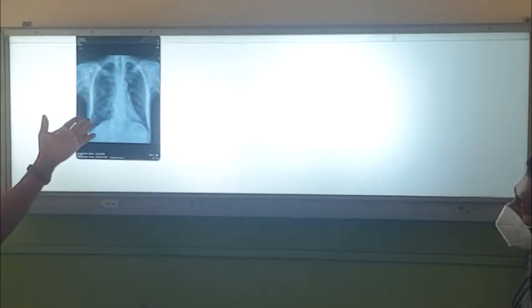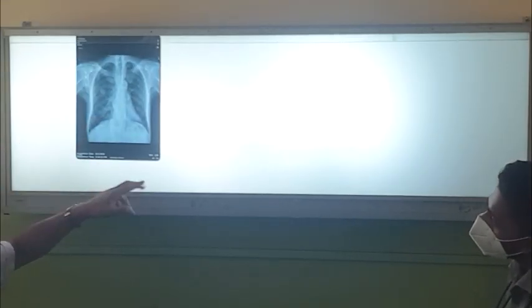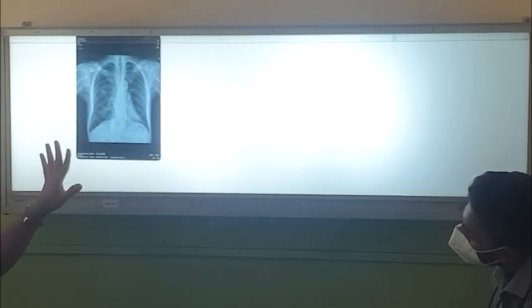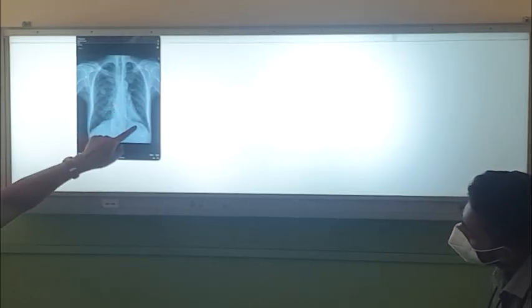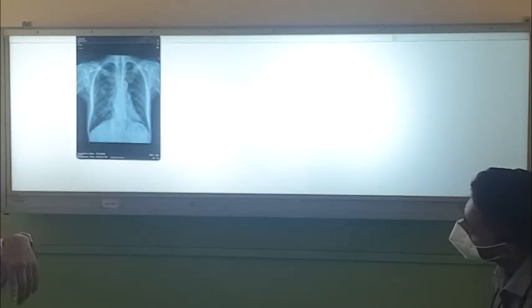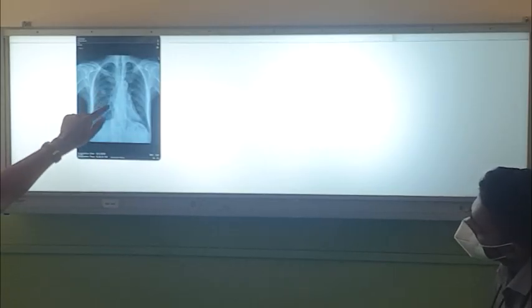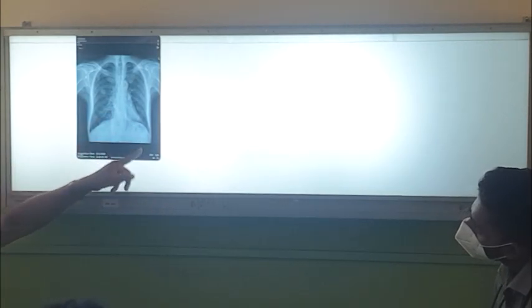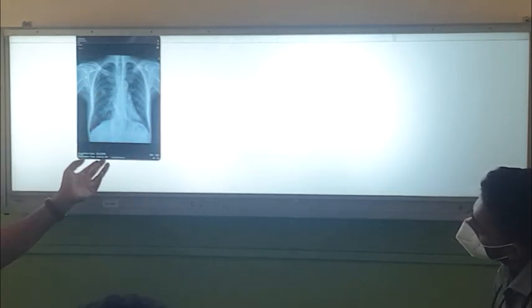This is a patient with carcinoma of the esophagus who has undergone stenting. So you can get these things in your spots. This is an esophageal stent, coming with a rounded lesion, possibly a secondary deposit. So you have to detect this esophageal stent coming with the secondary deposit there. This is how you describe it.